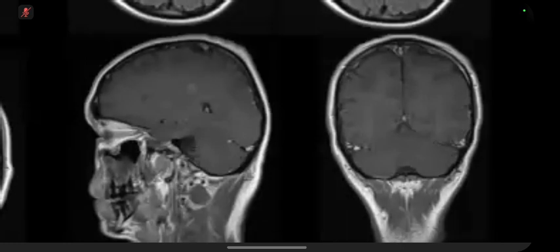Look here, DWI, and the central portion is low on ADC. And this is a pitfall, because I have seen people reporting this as restricted diffusion and calling it a lacunar infarct. So you must know that an active plaque of MS can also show restricted diffusion.